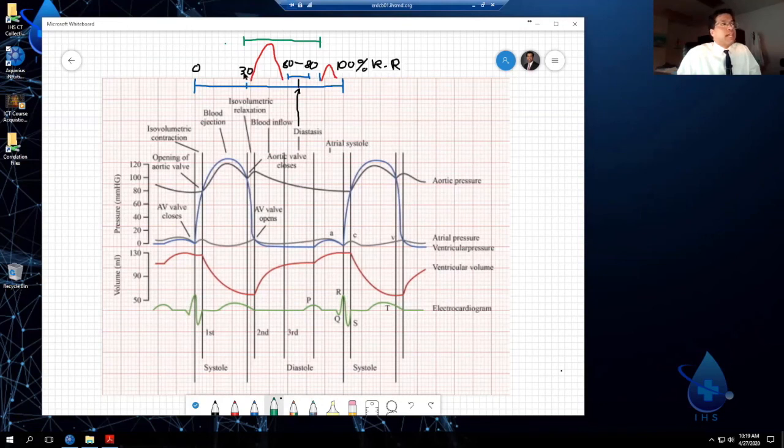And there's a little area here of time when the heart is actually frozen as well, and that's late systole. At the end of systole, after the heart has ejected all its blood, it relaxes for a moment, and that's called isovolumic relaxation, and that's right here. So that tends to be at about 35, okay, before the E wave begins.